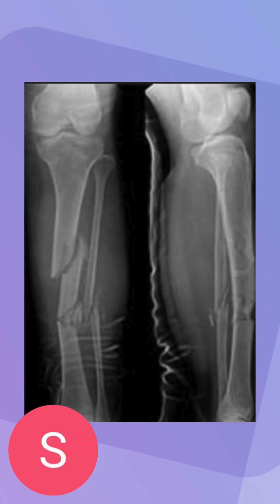So it's all about perspective in radiology. You have to take many different angles of these x-rays because certain angles may exclude information that you need to know. For example, if you're going into a procedure and you were supposed to take this bone out, if you're looking at a single angle, you're not considering a multitude of them, you're not going to be able to see the different nuances in the bone structure because you're only looking at it from a certain way. However, if you have these multiple compounding views, you can have a better representation of how the bone looks and a greater understanding of what's actually happening. Because it could slightly depend on how you look at the bone structure.